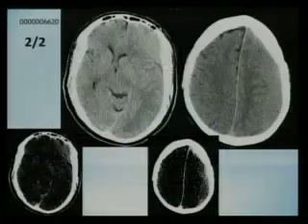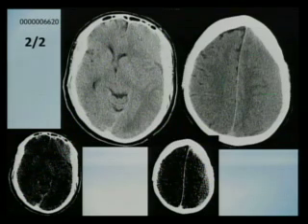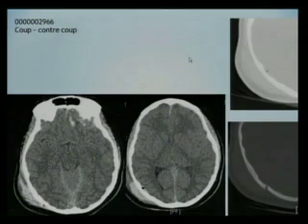So you see that this component, at least, of the hematoma is biconvex, which is more commonly seen in an epidural hematoma. This is the coup contre coup. I mean, this is where the patient banged his head against whatever hard object. And then you get a hemorrhagic contusion, practically 180 degrees.